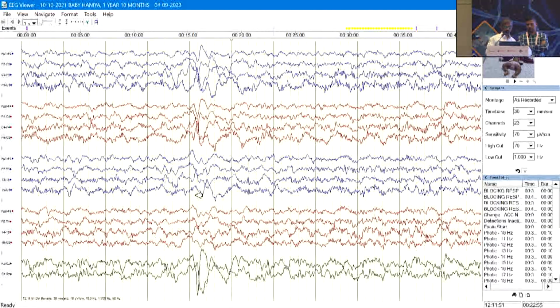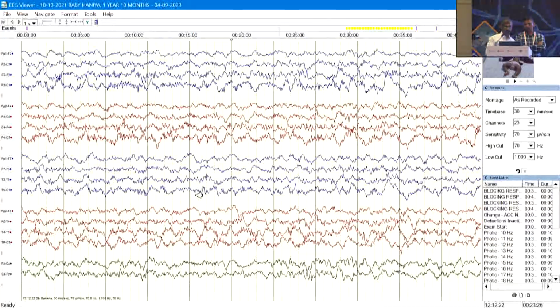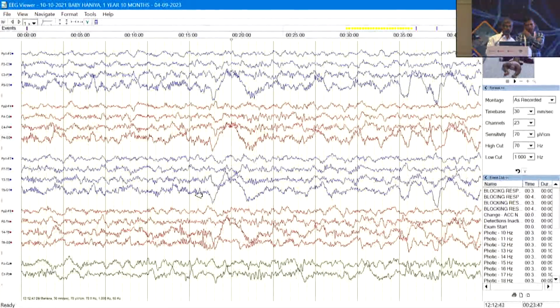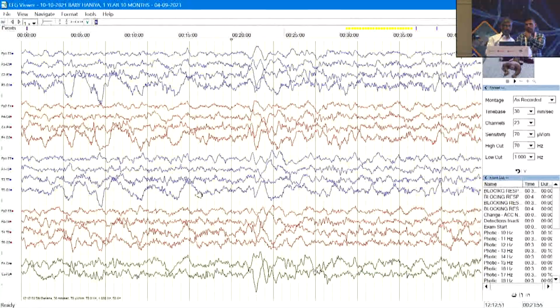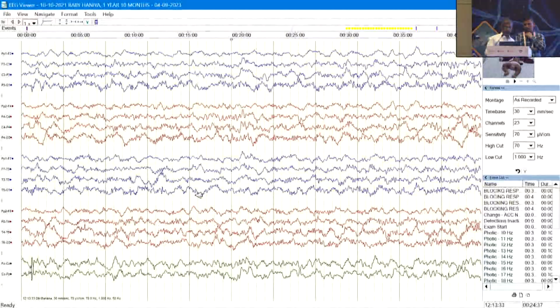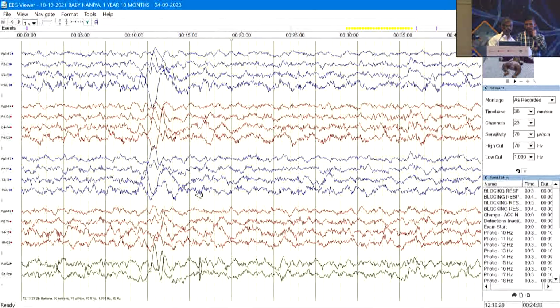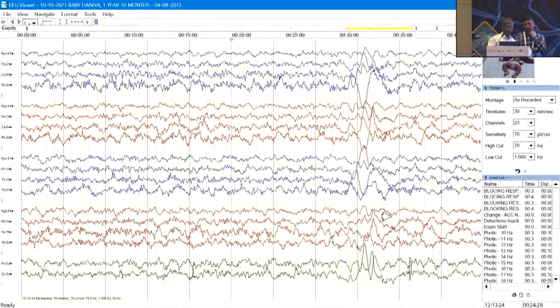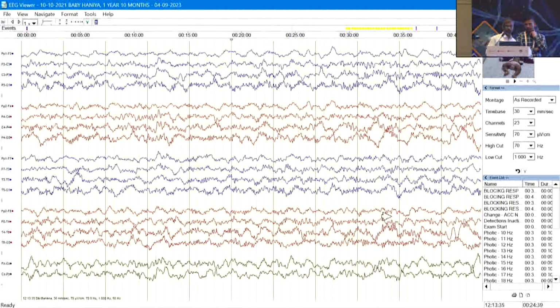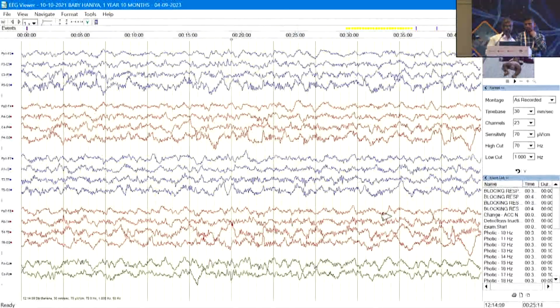Okay, so it may be that we are just emphasizing and repeatedly saying the same things, but these are the most common errors that happen in pediatric EEG reporting. That's why we are overemphasizing on these points. So above 3-year-old EEG is almost like your older child or adult EEG only, but less than 3-year-old you have to be very careful about these higher amplitude waveforms, especially if you are looking at paper printout EEGs.